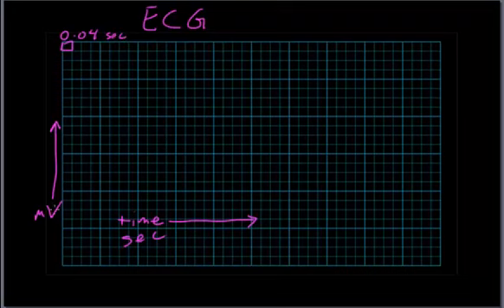We're not really going to be worried about the y-axis now, because for my students, the pathologies that we're going to be thinking about are problems with the cardiac conduction system that are going to elongate certain sections. So we're really focused on this time dimension down here.